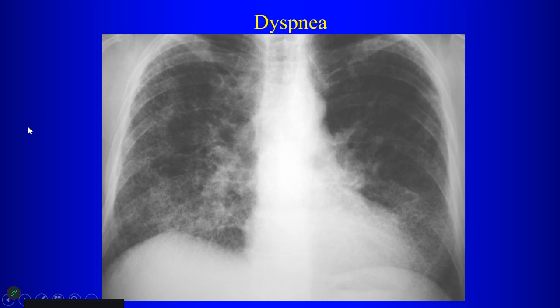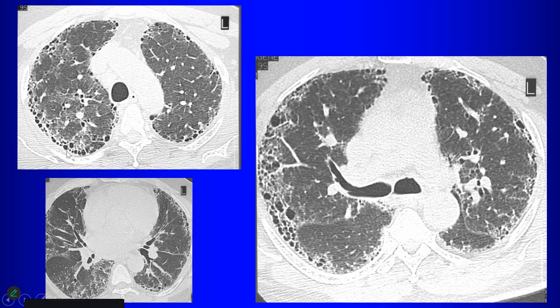All right, so this patient has shortness of breath, and we can see some reticular opacities. The distribution is lower lung and peripheral, right? And the CT looks like this. Okay, so what's the finding on the CT now? Yeah, so there's honeycombing, there are reticular opacities, it's basilar and peripheral predominant. So this is the typical appearance.